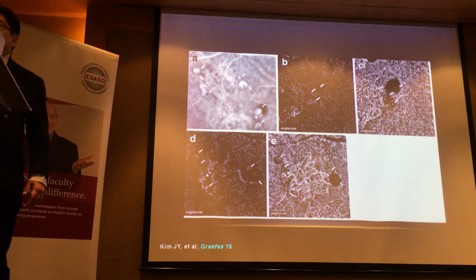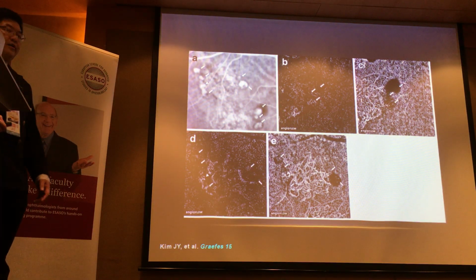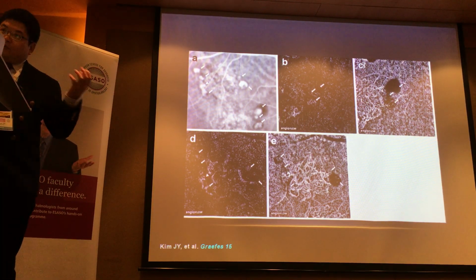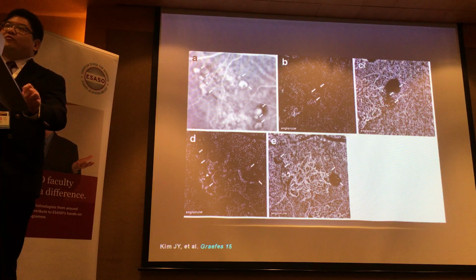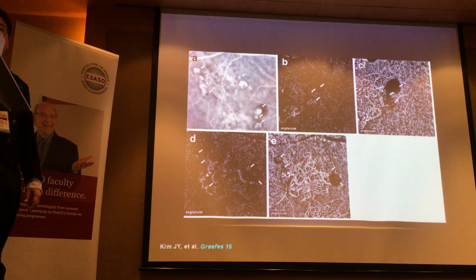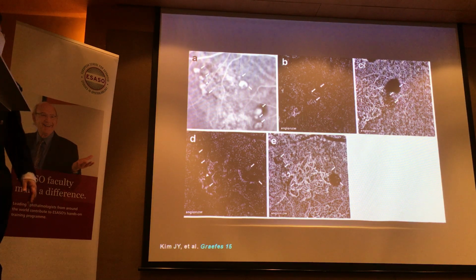All right, if you just see this, how do you know this is PCV? Why is this not AMD? All right, but do you suspect it? Are you then going to say, well, but I see an orange nodule there? Well, you can, but you don't have that confirmation. And secondly, if you were intending to do PDT for this patient, combination therapy, PDT and anti-VEGF, where would you laser?